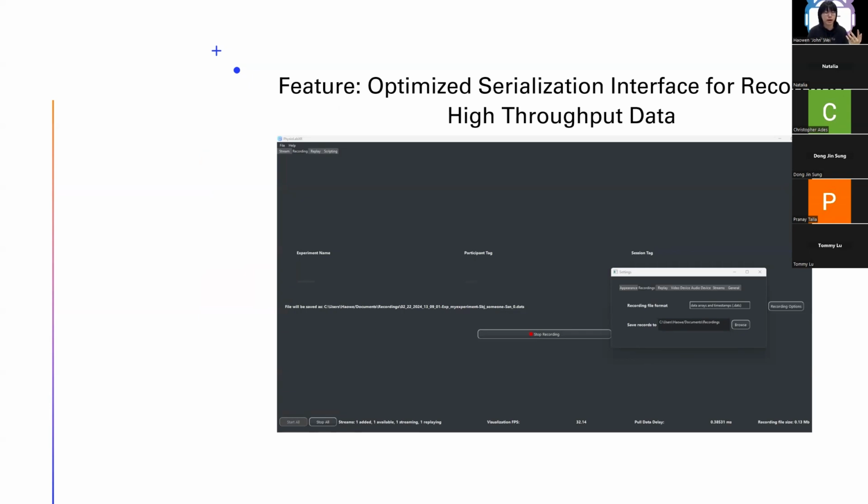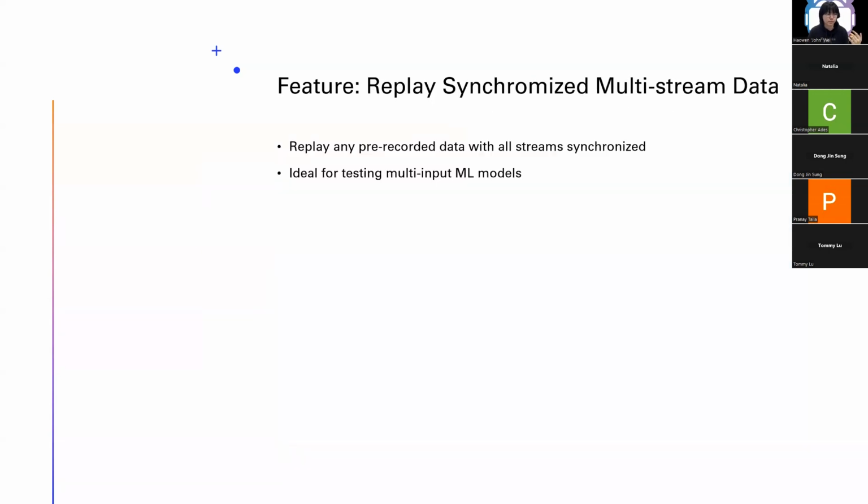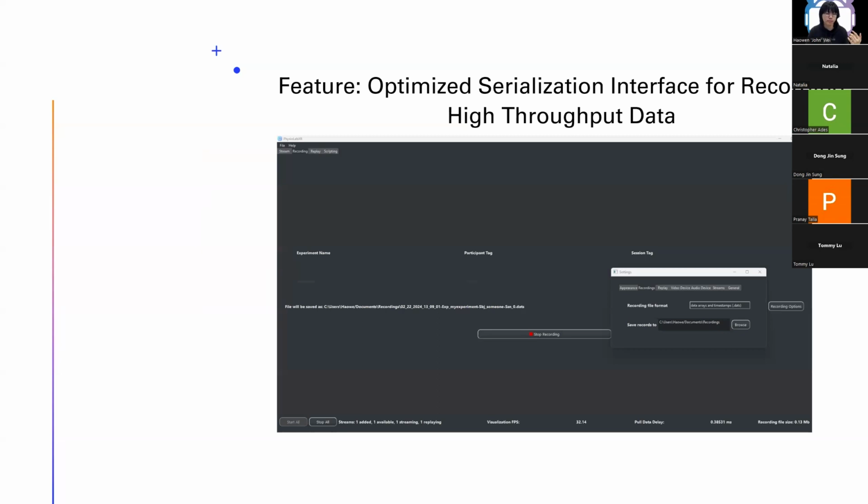So here we have the graphic user interface for recording, and you can specify the data format, the root directory, and the experiment name, as well as the participant tag and session tag.